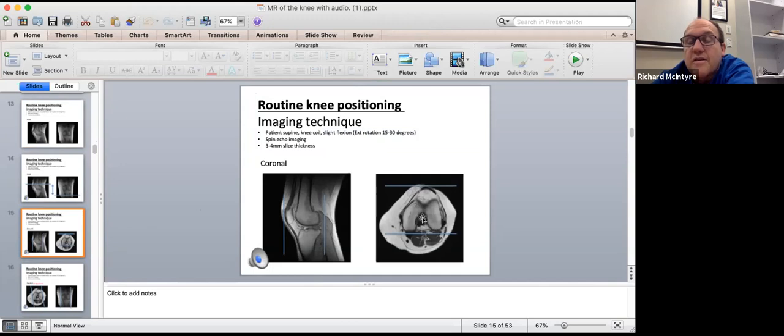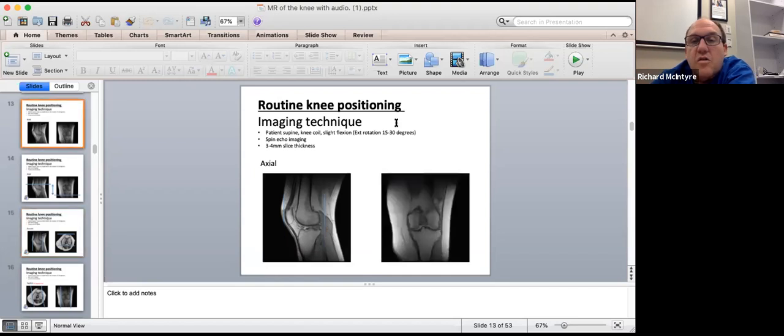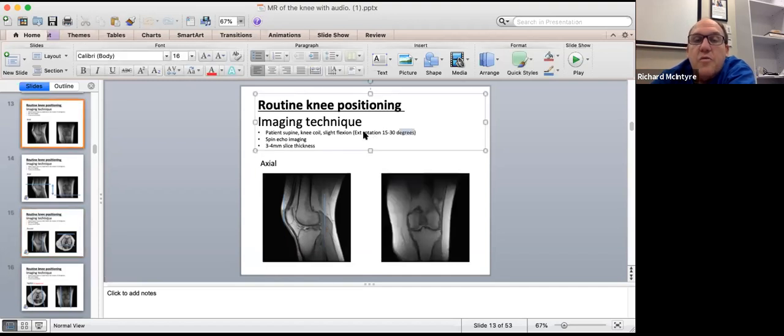If the patient's knee is externally rotated, then that ACL is going to go vertical, and if we do orthogonal imaging, we're going to go along the plane of that ACL. In the early days we couldn't angle the images, they had to be straight. So now I like to keep that external rotation on to help you remember to angle your images.